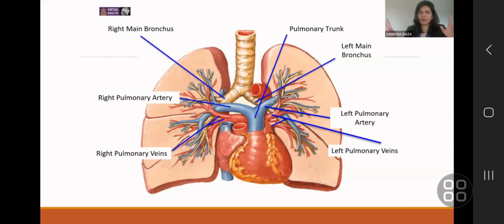If there is increased opacification and you are thinking about fibrosis, then you look at the hilum and think, is it too different? Is it too asymmetrical? You don't just look at the hilum and think, oh, one is too much higher than the other. Is it pathological? How can it be if the lung around it is normal? Does it matter? No.